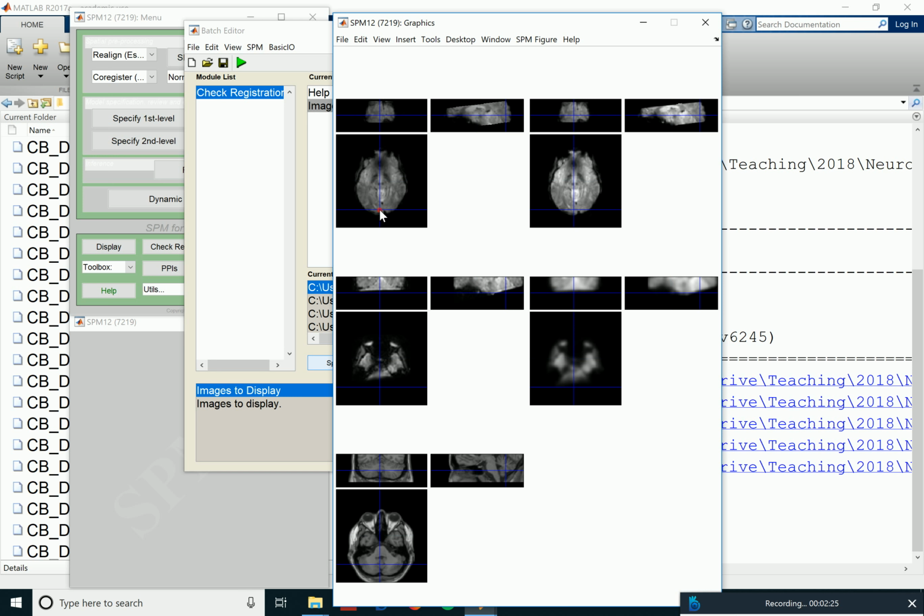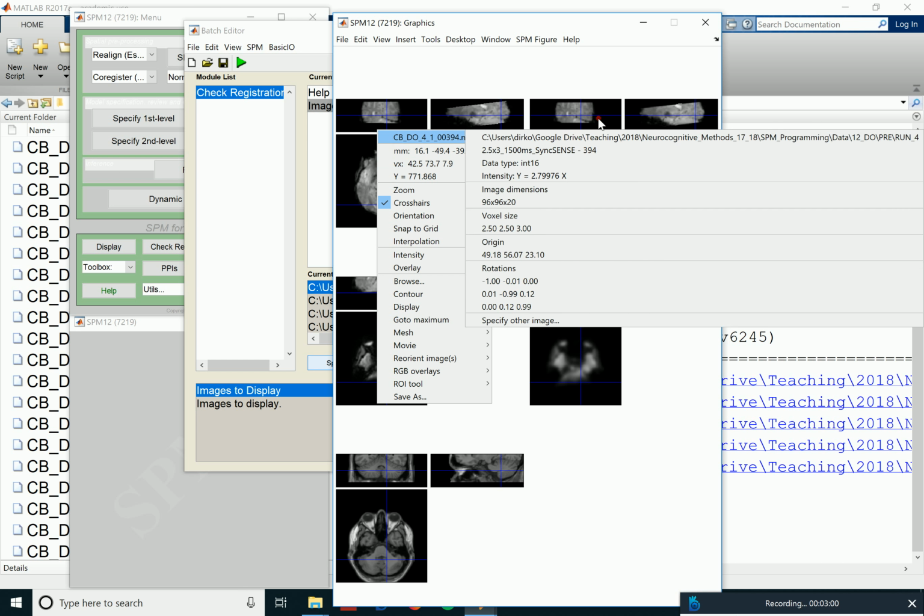And that was maybe not the best way to do it. It's a little bit annoying. So you can do it in a better way. The first one should, I guess, be an MNI template, and then it makes a little bit more sense. But anyway, we have here the original one. It's also not labeled, so this is why I also at one point had my own thing, so that you always know what that is, but you can look it up if you right click.